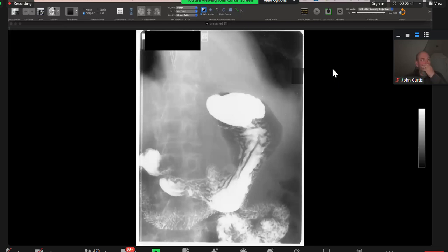This area over here. If I can have other views, I can also confirm if this changes with the peristalsis. Otherwise, this could be some.